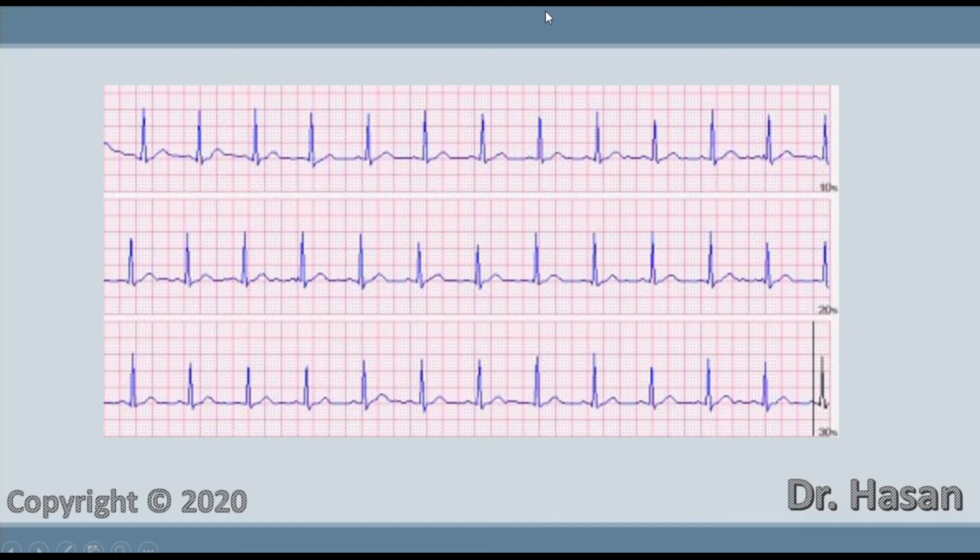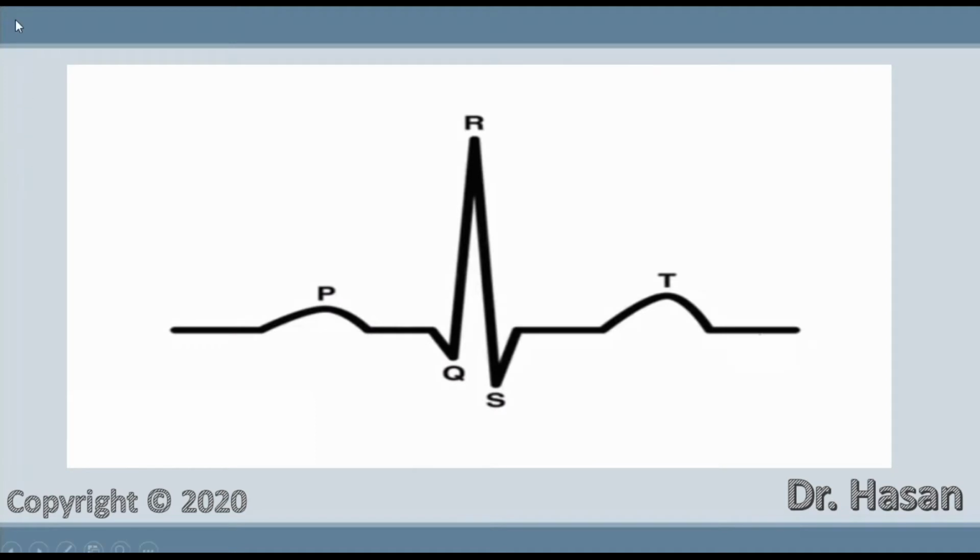It can be seen from the figure that any ECG consists of some horizontal lines and some elements that are formed of waves. The waves always alternate, now small, then large. They look up and down. If you look closely at this ECG, you can notice the repeatability of some elements. Take one such ECG element and schematically increase it. What does this element consist of?